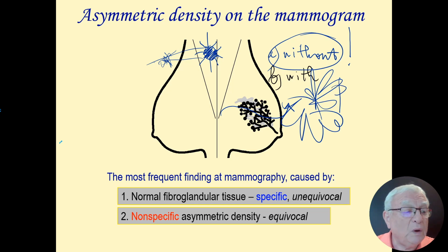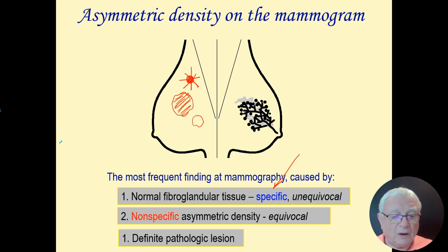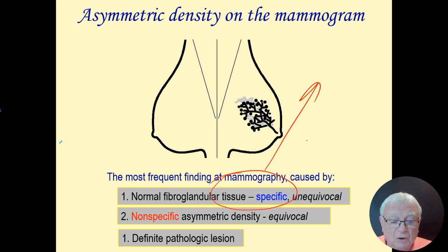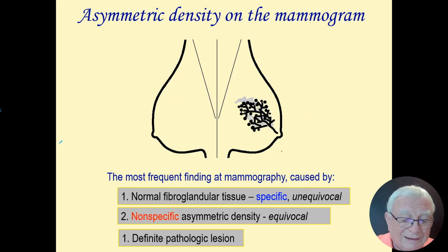After that, we are going to spend so much time on the differential diagnosis. I think having a cyst in this area, a fibroadenoma, a palpable cancer or non-palpable cancer, fairly large size, that's not a big deal. This is a differential diagnostic problem, not much of a perception problem. Normal fibroglandular tissue can be symmetrical. There is no asymmetric density. That we can handle. When there is an asymmetric density, I am absolutely sure this is a normal parenchyma.